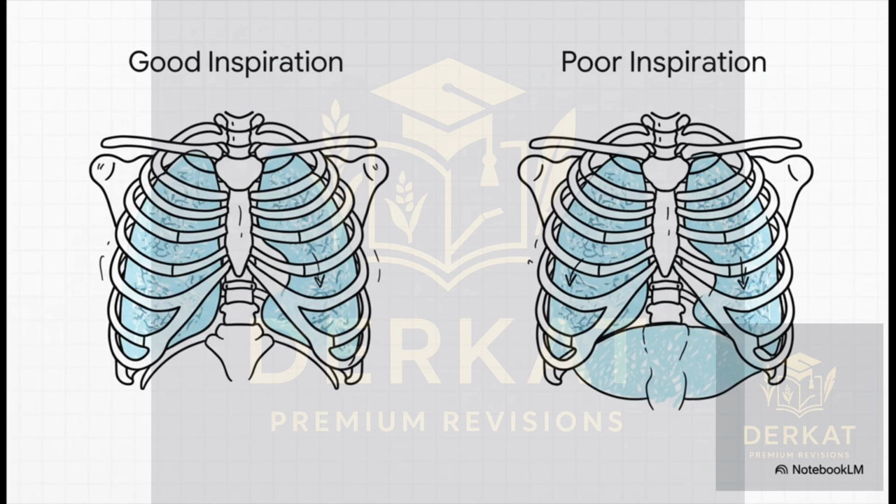Next, I is for inspiration. In other words, did the patient take a deep enough breath? The way to check this is to count the ribs you can see above the diaphragm. You're looking for at least 6 anterior ribs, which are kind of faint and point down, or 10 of the more obvious posterior ribs. If you see fewer than that, the lungs are going to look all squashed up at the bottom, and that can easily be mistaken for pathology.